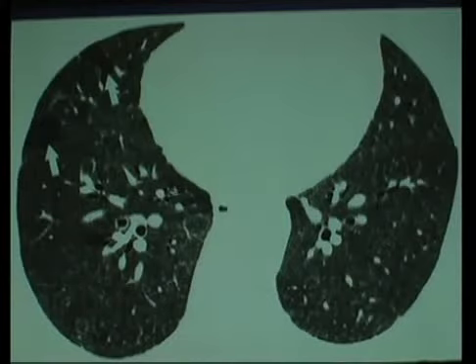One of the things about hypersensitivity pneumonitis, and I showed an example of IPF earlier that actually mimics subacute or chronic HP: if you look carefully, you see all these poorly defined ground glass nodules. So this is characteristic of HP. The other thing that's characteristic of HP is that you tend to have sparing of secondary lobules. It's not that the lobular septa are thickened, it's just that for whatever reason the antigen didn't reach this particular bronchiole, and so this particular secondary lobule was spared. This secondary lobule was spared. If you see ground glass nodules or haziness like this with sparing of secondary lobules like that, think again about hypersensitivity pneumonitis. These things can be really profuse.